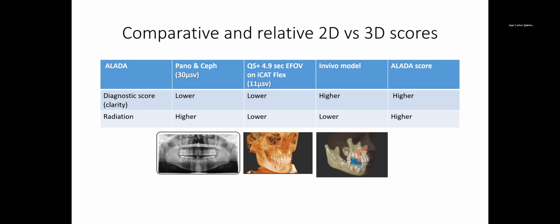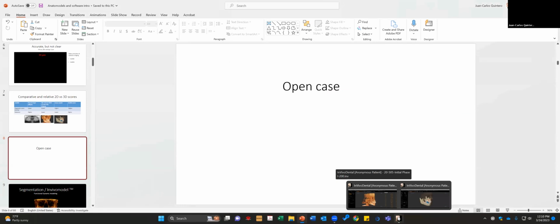So the ALADA score for an Invivo model is higher than the score of a cone beam by itself or a two-dimensional series for diagnostic orthodontic purposes. I just want to show you a case just to tease everybody a little bit.